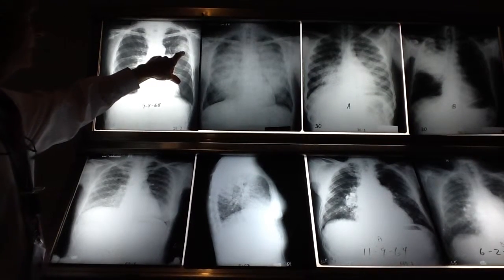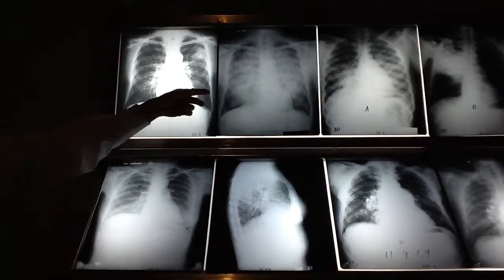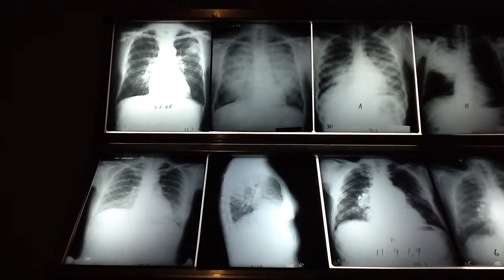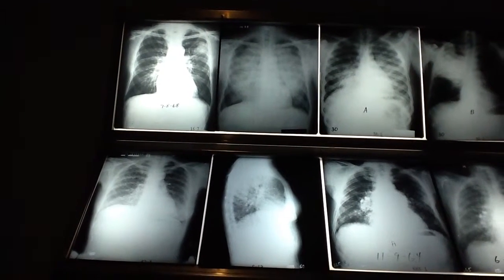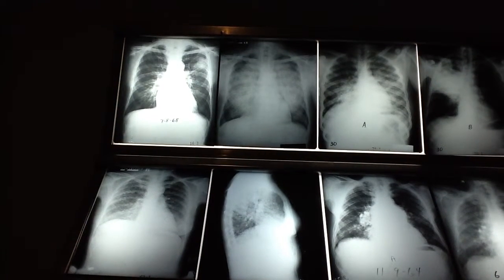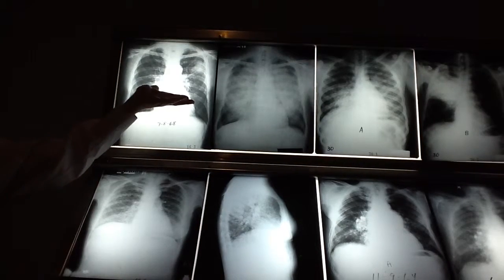So we don't know what this is. This could be anything, but it's likely an infection. It's most likely a pneumonia, subsegmental pneumonia. This is not a pneumonia. This is pulmonary edema, which is water, plasma fluid. And these are the 2 most common reasons for having airspace consolidation. Remember, blood, pus, water, protein, cells. We said protein and cells are really rare. So blood, pus, and water are the 3 most common, and the 2 most common of that are pus and water.